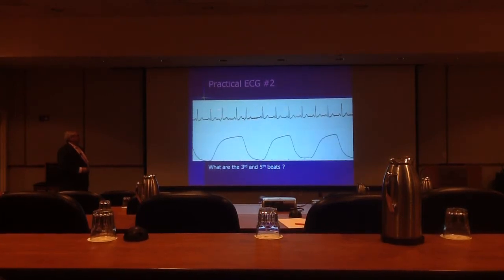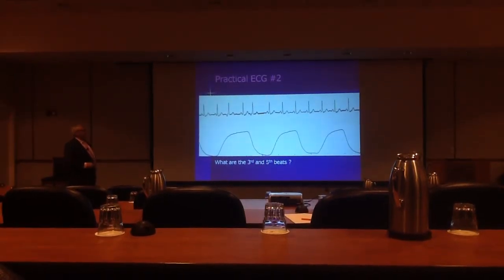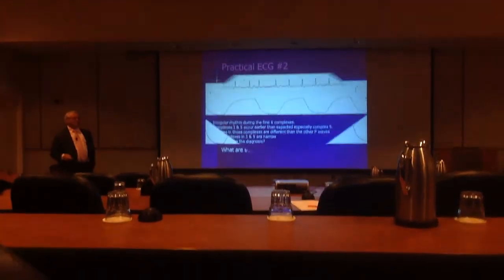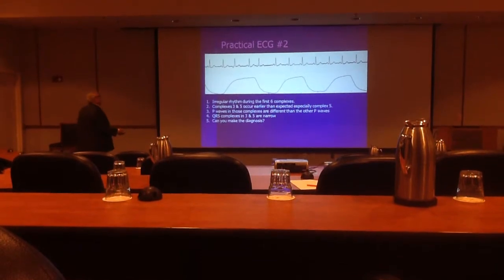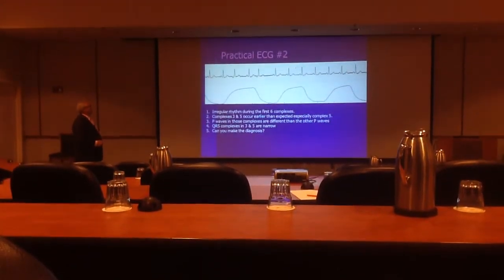So if I take this measurement from here to here to here, that's less than the distance between three normal beats. Funny looking P wave, a beat that occurs prematurely, a normal looking QRS complex, a non-compensatory pause, that makes this what? A PAC or a PJC. Something either coming from the atria or coming from the junction, but it's certainly not a PVC.